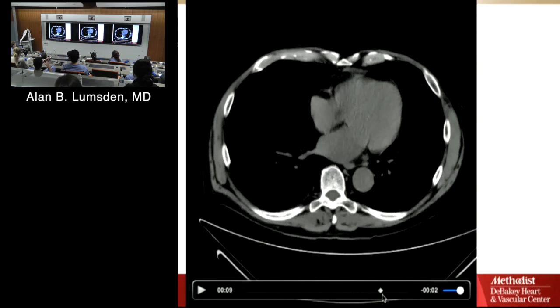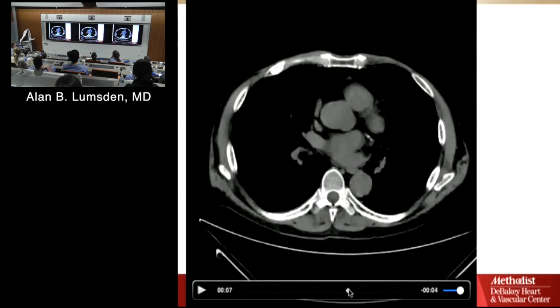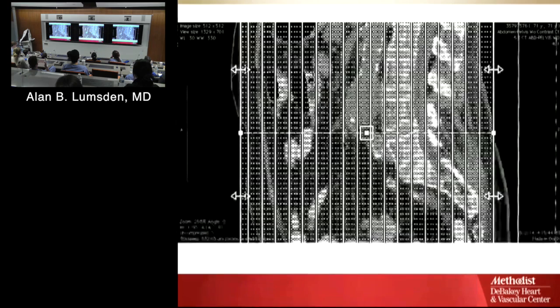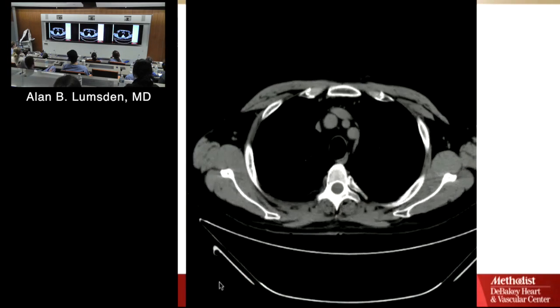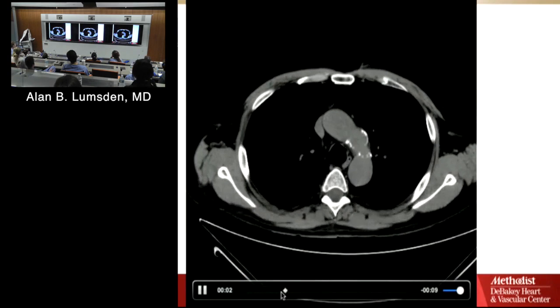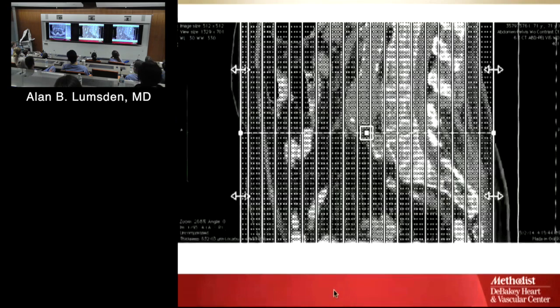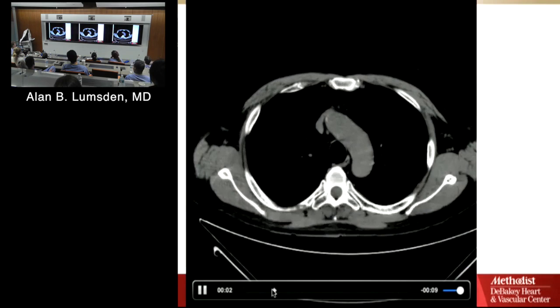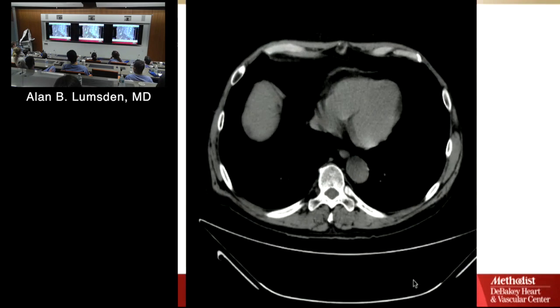All right, we're coming down. Now watch the aorta swing towards the midline, okay? The reason this is important is that a lot of the time, let me go back one, people mistake diameters of the aorta because they're really looking at angulation of the aorta. So for example, that's not an aneurysm, that's just the arch. Same thing happens down here as it starts swinging towards the midline.